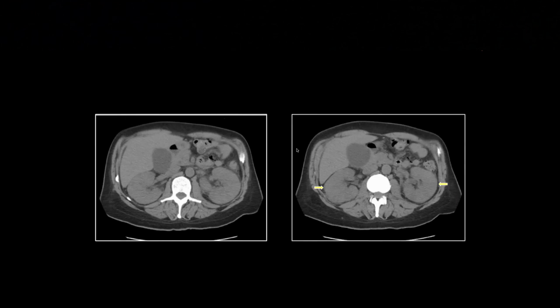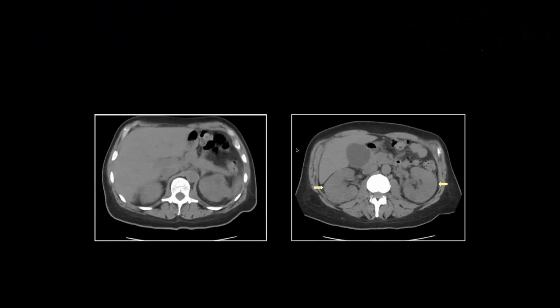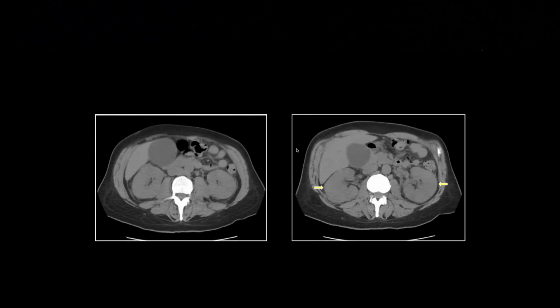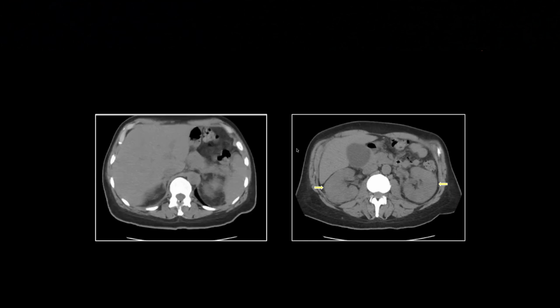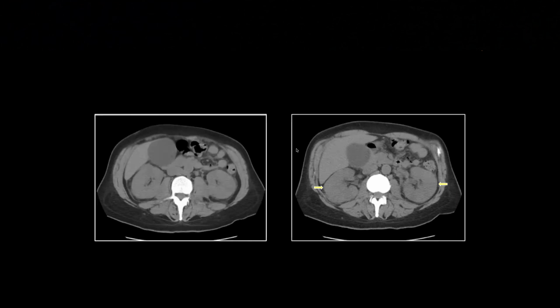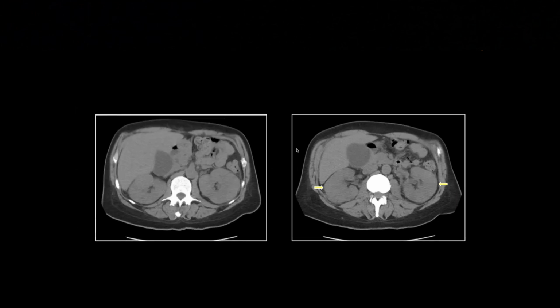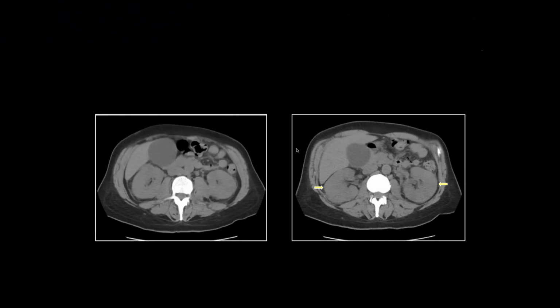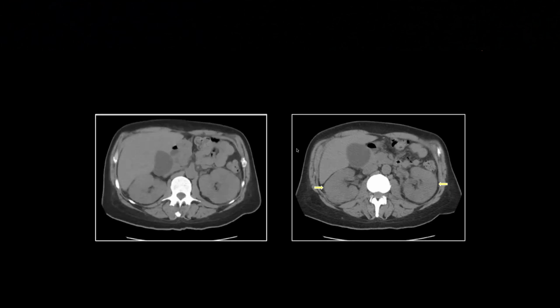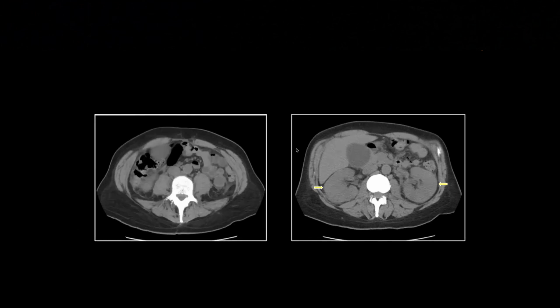I always remember this was one of the first of these I saw. It dates back to my private practice days. And I always remember saying to my friend Gordon, who was particularly sharp, "Hey, what about renal lymphoma for this?" And he rolled his eyes and he said, "The most common presentation of renal lymphoma is bilateral renal masses, and lymphoma in the kidneys does not tend to infiltrate diffusely such that it would have this appearance." And I thought, huh, that's weird, because I always thought of lymphoma infiltrating things and just generally enlarging them. And I went and looked it up, and he's absolutely right.